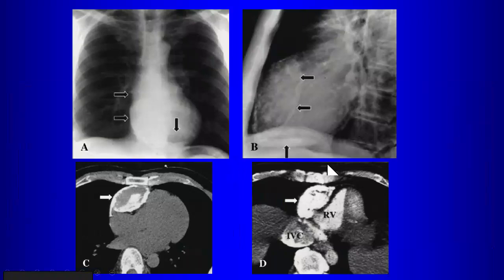Patients can also have loculated collections in the pericardium, especially after infections, that can go on to calcify. So we might see that also in some unusual cases. And that also can impair cardiac function. See the dilated IVC in this case.